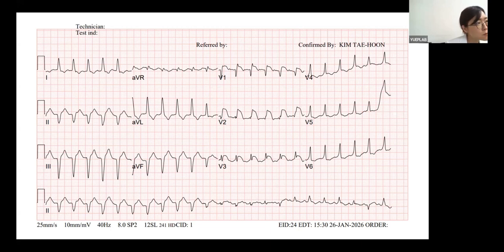So how's the rhythm status of the first half and the later half? The first half looks like wide complex tachycardia, and then there's some fusion beats, rhythm change. Because when you see the Q, the later half part shows a P to QRS relationship.